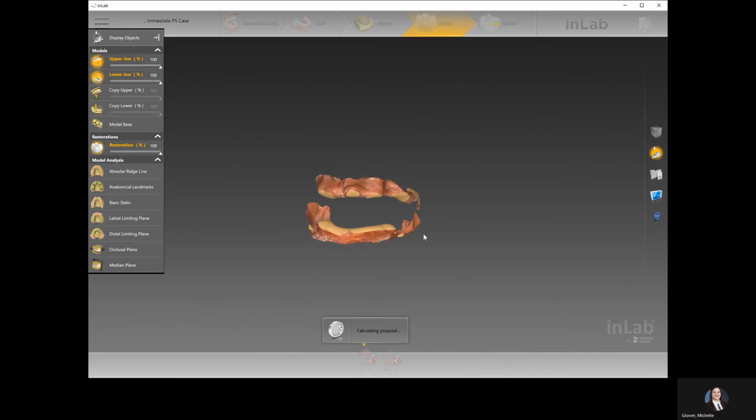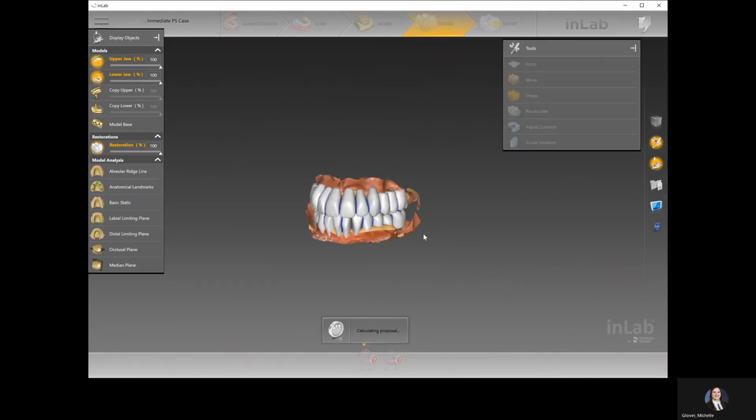One thing I do like to do, especially if I'm going to be milling or printing my teeth, is I like to try to give them a little bit more depth, a little bit more definition. So there's a really nice tool in Edit Element known as incisal variation. It comes in very handy for any anterior teeth. So I'm going to highlight my upper 6 anterior teeth in just a moment here once I have all my teeth proposed. And I'm going to be able to add that depth and definition using the different variations.